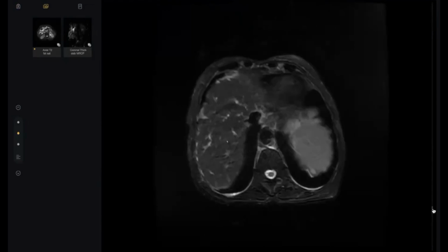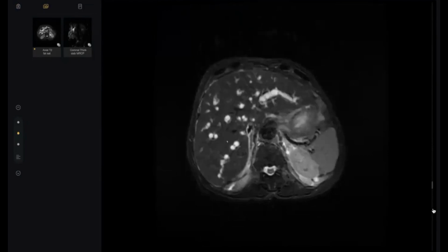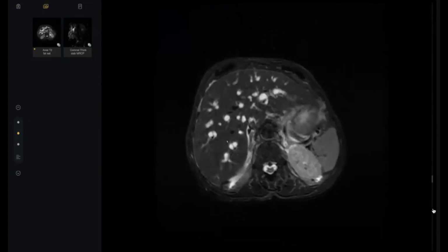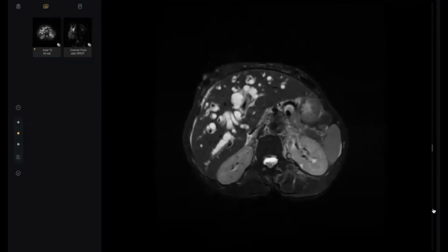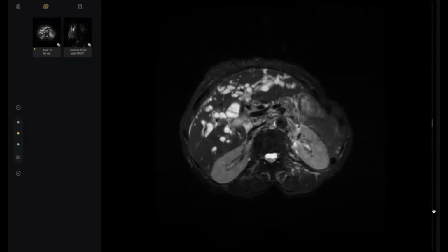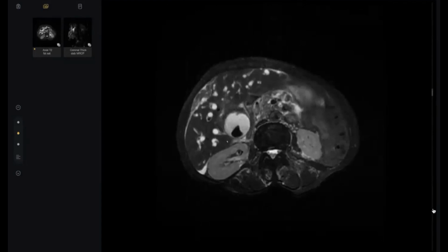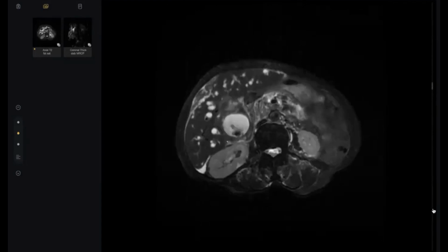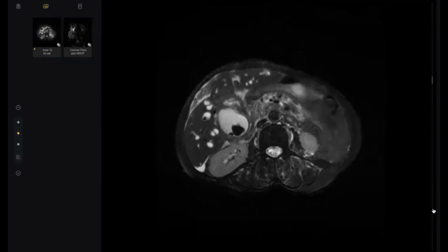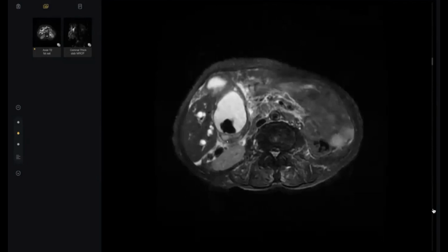So I'm provided with T2 weighted MR images, fat sat images of the abdomen, in which I can appreciate markedly dilated intrahepatic biliary channels and gross dilatation of the central intrahepatic biliary channels near the porta hepatis. These are converging centrally at the level of porta hepatis. Gallbladder is distended and shows a hypointense filling defect in it, representing a calculus. I'm looking for some pathology at porta hepatis, which is causing obstruction.